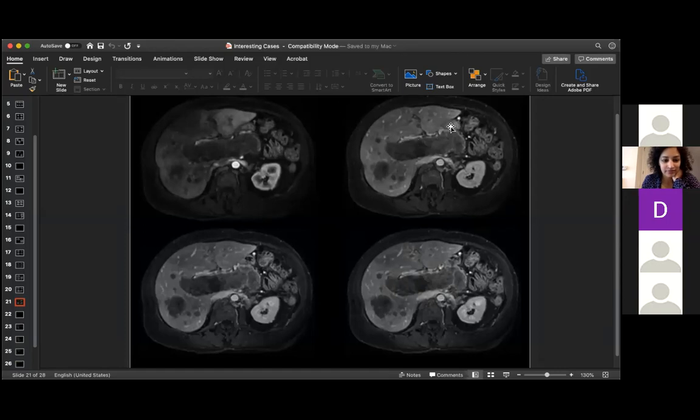So how I outlined here, it has a pretty defined contour. Am I trying to say something by saying that? What kind of tumor does that in the pancreas? I'm still thinking neuroendocrine, which can be cystic. Amar says lymphoma. Okay. Right, lymphoma tends to be a little bit more ill-defined though. Okay, a rare tumor of the pancreas. It looks mostly intravascular, right? Or at least it has a very large intravascular component, but it's replacing the pancreas almost entirely.